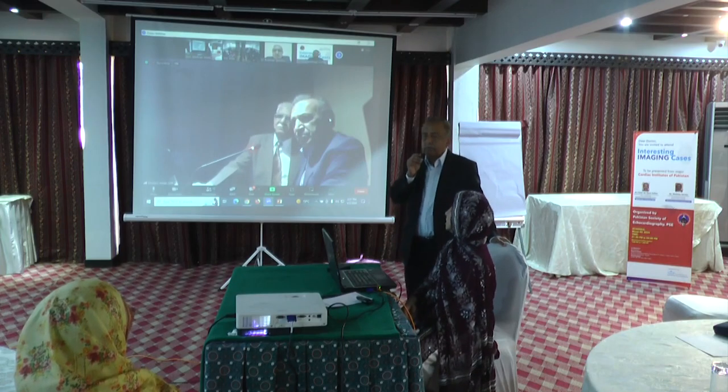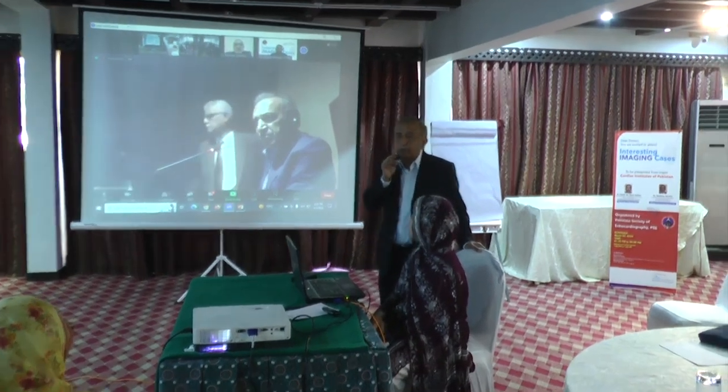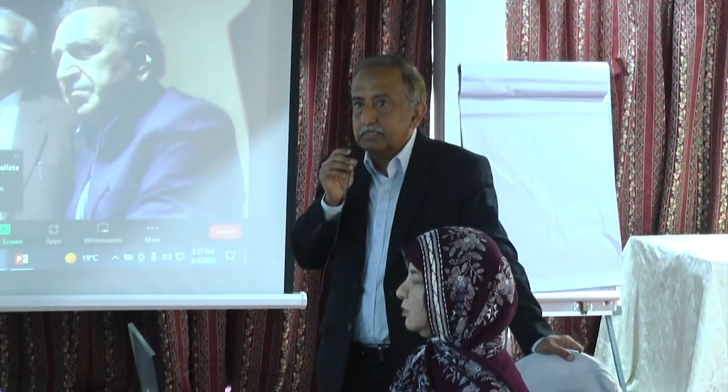I think that's a very valid point, Dr. Ayub. लेकिन इसमें प्रॉब्लम वही था कि पेशेंट was quite unstable and probably it was difficult to control the heart rate. But you are right, in the presence of AFib you can do the CT after controlling the rate, and maybe we can take the comments from Dr. Imran and Dr. Parveen agar koi comment aapka ho.